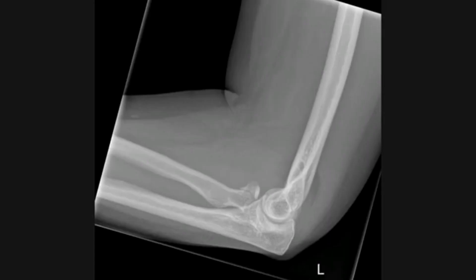Here is a very complex injury where there's a fracture of the radial head, a portion of the radial head has gone back into the joint, and prior to this reduction film there was also a dislocation of the elbow. You can clearly see that there is a posterior fat pad, and the anterior fat pad is no longer shallow along the anterior cortex, but it's now almost perpendicular to the anterior cortex because of the distension caused by the elbow effusion.